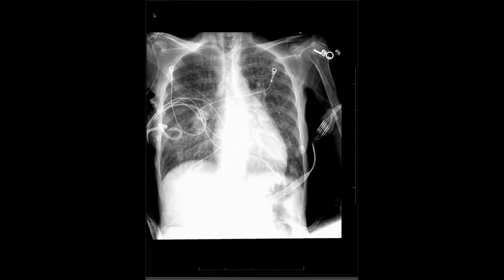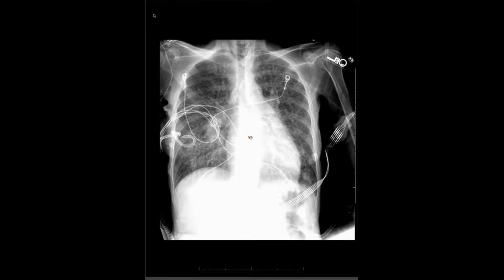And then the echo from more recently. The other thing is she looks 70% LVEF. I'm sorry, you know, she looks extremely scrawny here. This woman has no soft tissue outside of her ribs. And I just wonder if she's got low protein and she has edema because she just doesn't have anything keeping the fluids in her intravascular space. She looks really malnourished here.